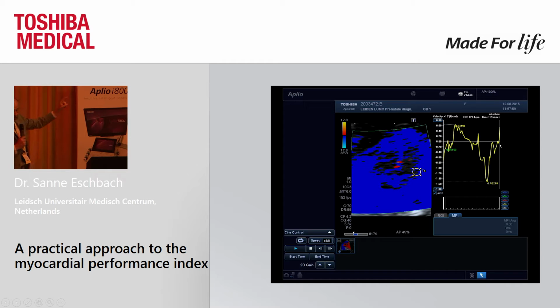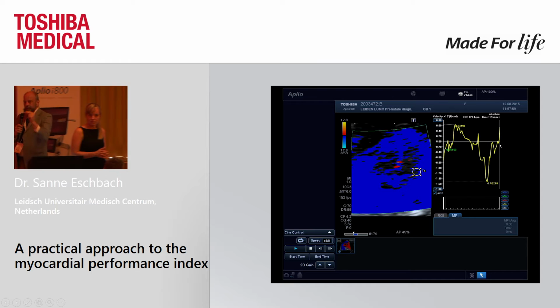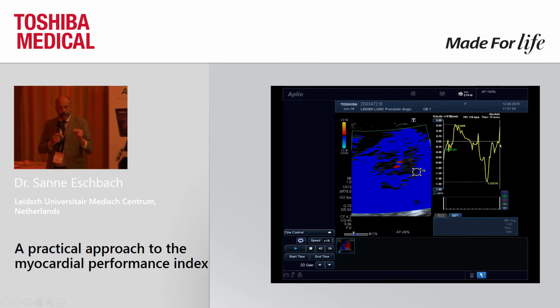If you compare it with the normal, you see that this period is shortened, and this is prolonged. So it's more about the ratio than the actual milliseconds themselves. Because if you make a ratio with short distances and the short distance has an inaccuracy, it will be translated to the calculation of the ratio.